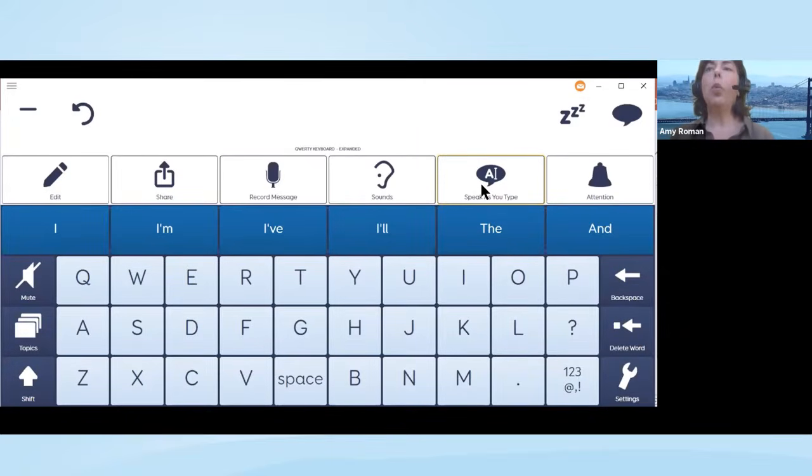They might not want it speaking while someone else is. They want to construct their message silently, and later they could hit the speak button. They would be required to hit the speak button to speak that message. Otherwise it would be silent. And this toggles off and on.